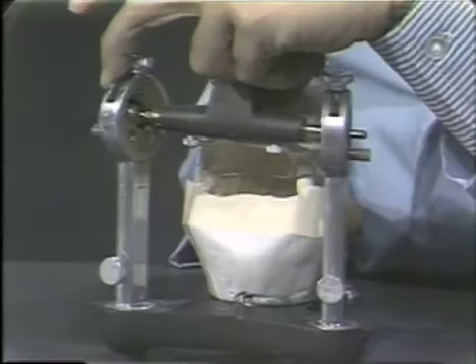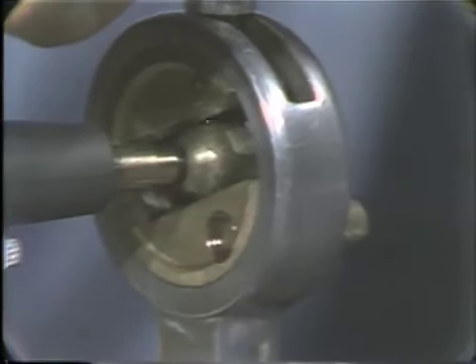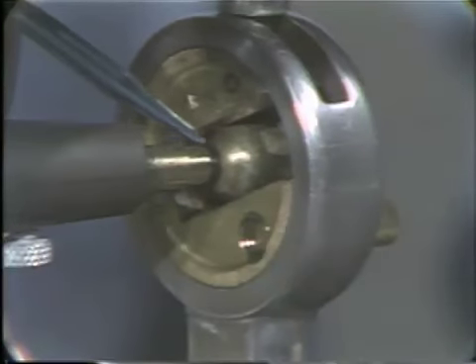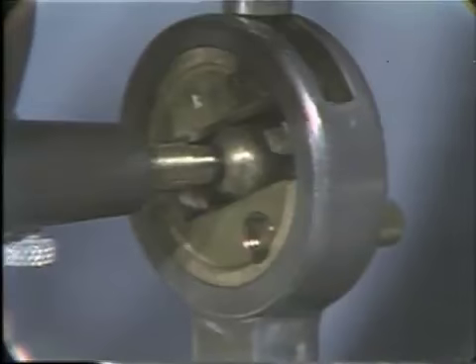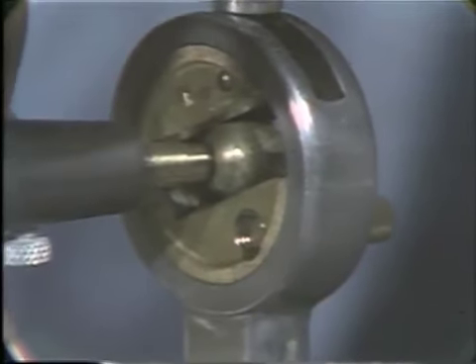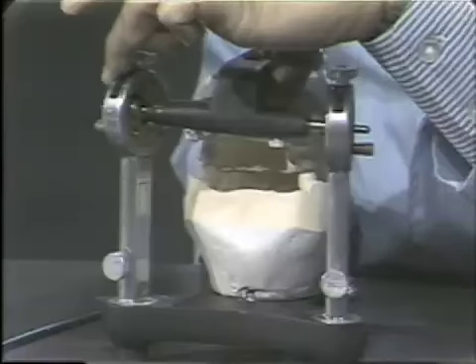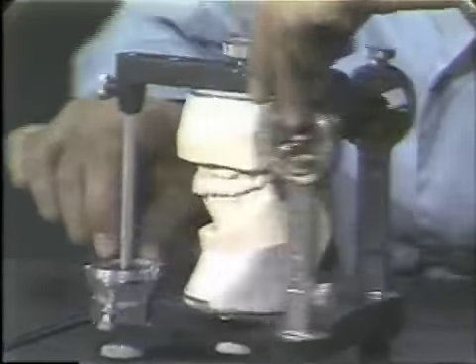Now when I go into a right working direction, you can see the gap between the sleeve and the condylar ball. Now as we're rotating, this would also simulate the right working condyle going slightly lateral. Now this will make up for the immediate Bennett side shift on the patient.